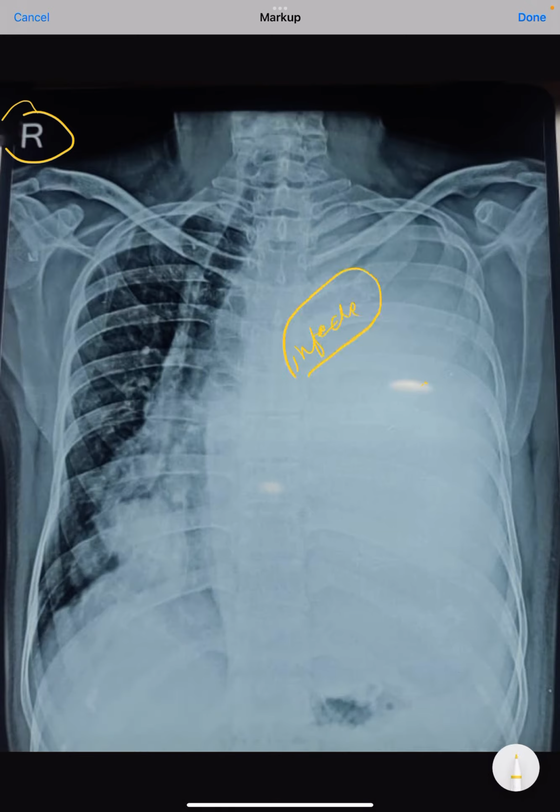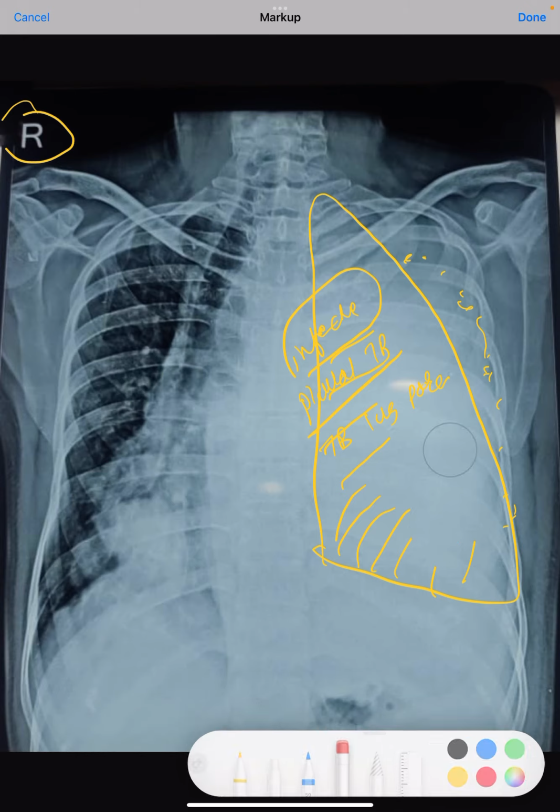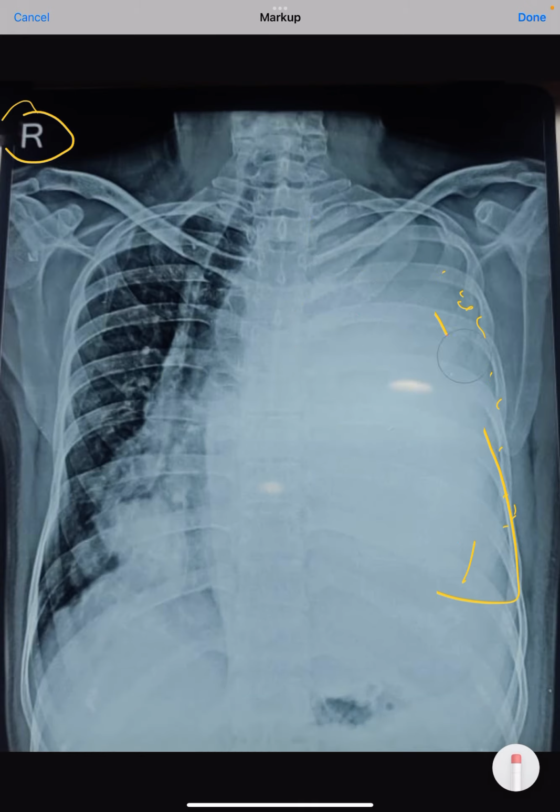Any infection like pleural TB or TB of lung parenchyma, which will have consolidation, can definitely create large pleural effusion. As well, if someone has any CA lung or CA breast or any cancer with metastasis to the pleura, this pleural metastasis keeps on creating the pleural fluid again and again. So the patient may have malignant pleural effusion.